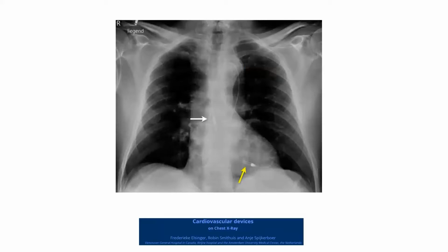Balloon, intra-aortic balloon. No. Impella. Impella. Thank you so much. This is Impella.